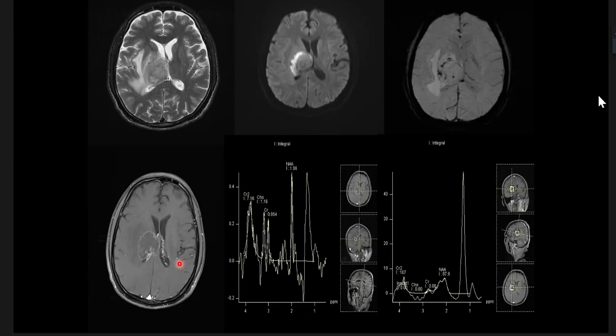Yes, sir. Next. Let us come to the lymphoma now. Can this be a lymphoma? Because the lesion is in the thalamus. The thalamus has a propensity for lymphomas, gangliogliomas, then metastasis, infections, and demyelinations. Correct? So lymphoma is a possibility, sir.